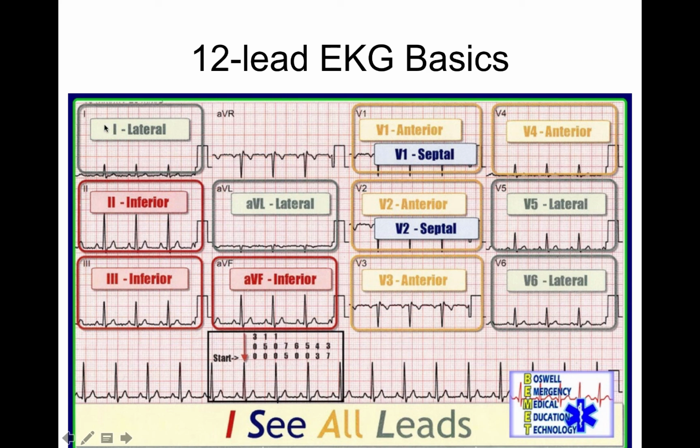So when you have an EKG, it's going to be a 3 second snapshot, 3 seconds snapshot, 3 seconds snapshot, 3 seconds snapshot. The very bottom of every 12 lead is a default set by the printer and the 12 lead device manufacturer. You may have what we call lead 2, or the hospital may define V1 there, because that's the most direct view of your heart.